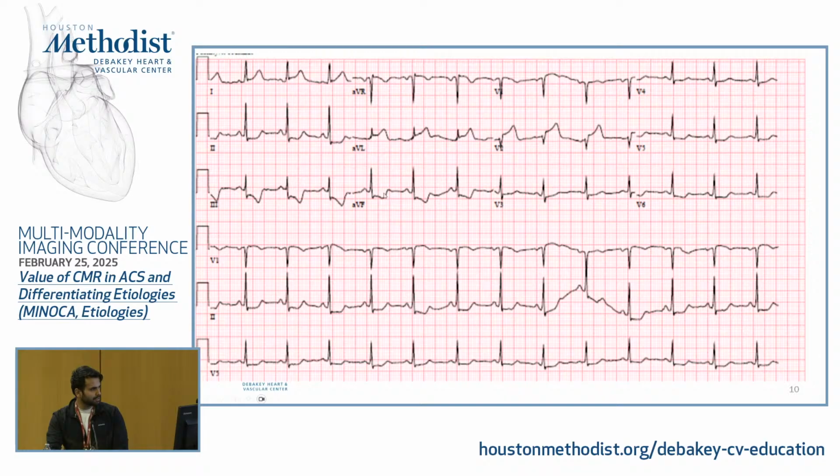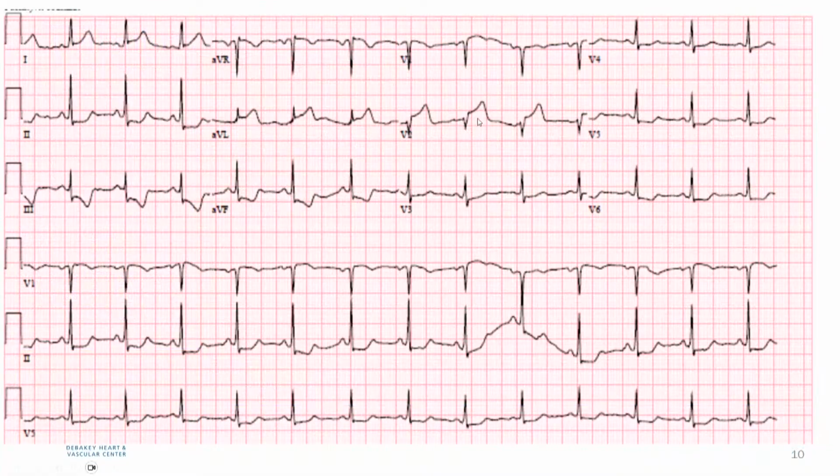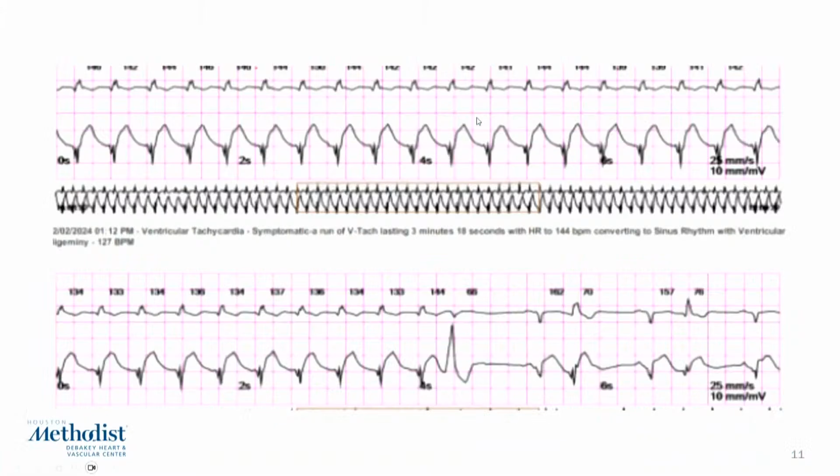So that's the EKG, and this one, light as day, you are seeing ST elevations in the lateral leads, and there are reciprocal changes. And there's also in V2, so in the septal leads as well. And this was the VT which was seen in the hospital on the hospital telemetry. It was 3 minutes is what they clocked it at.